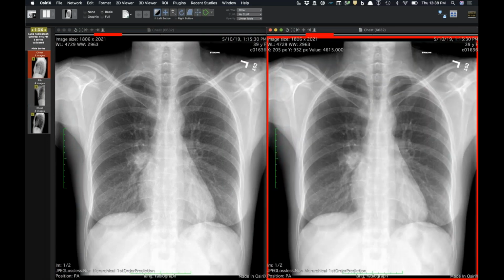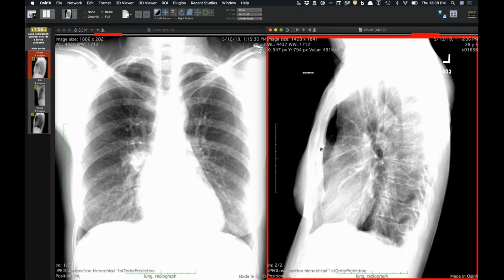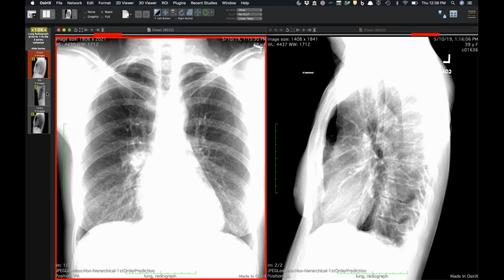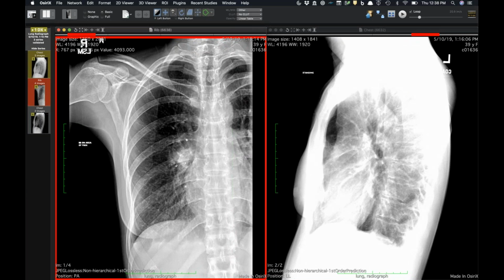Now there's a finding on this radiograph. This patient, you can see on the PA view, there's maybe a little increased opacity over the right hilum, and laterally you can see that there's this focus of consolidation anteriorly. Well, they did a rib series at the same time, and I'll show it just because you can see they put the BB right over there. So this person had anterior pleuritic chest pain, and of course no history of trauma.